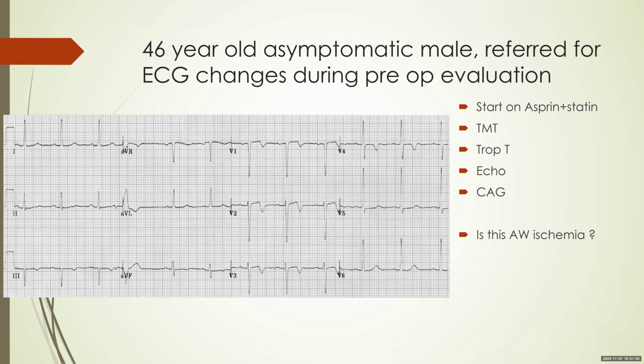So is this anterolateral ischemia? It is not possible to say, because T-wave inversions do not localize. So again, you can see this is a patient who is representative of many patients who actually come to your OP who are on statins and antiplatelets. Nobody is clear what the reason is why they have been started. It's mentioned as old CAD. We're not quite sure what the reason is, and he continues taking aspirin and statins for life.